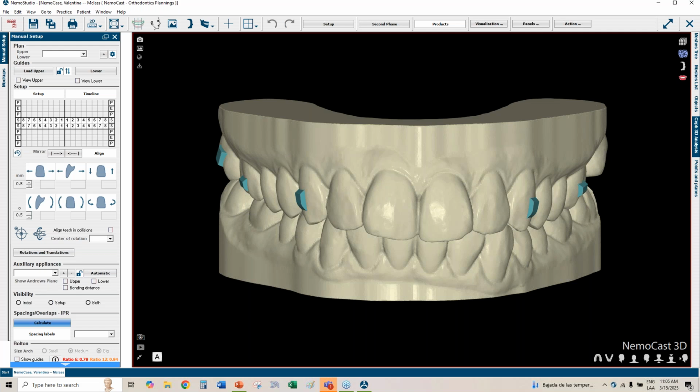Great. So, first of all, let's talk a little bit about diagnosis. As you can see right here, let me export this just a little bit for future reference. This is an extra thing you can do with Nemocast when you have already planned a case. You can export the full timeline like I have right here. In the settings icon on the timeline, I'm going to place it right here and send it to the desktop just so we can have it later and import it as well.